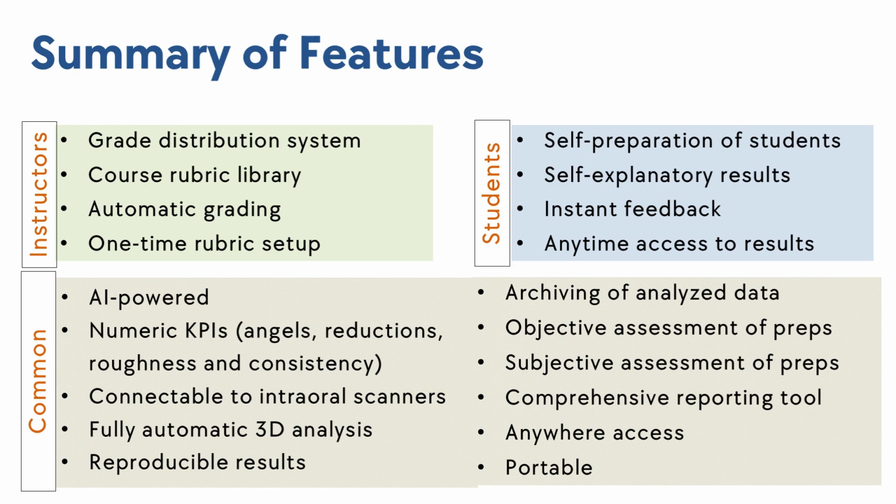3-dimensional and 2-dimensional preps, all within a single, comprehensive, user-friendly platform. It also provides efficient tools for self-preparation and self-assessment for students via access to their own instructor's reference prep.